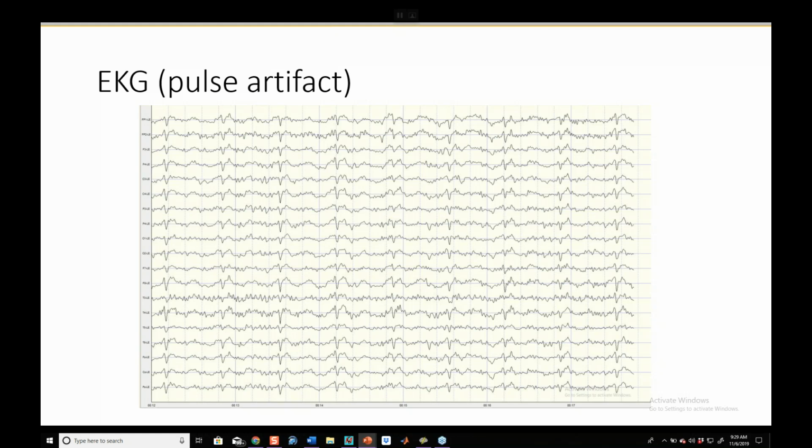Now, here's a trick, and it's something that makes this all the more exciting. When we're looking at every single line here, we're saying, yep, I certainly see that heartbeat. It's happening everywhere, sure enough. Now, we know from earlier what that means is that there's a contaminated reference because it's happening in every single channel, right? Okay, so here's the million-dollar question. Which ear reference, which earlobe is carrying the heartbeat? Which earlobe is contaminated? Which earlobe is not neutral? And you say, I don't know.